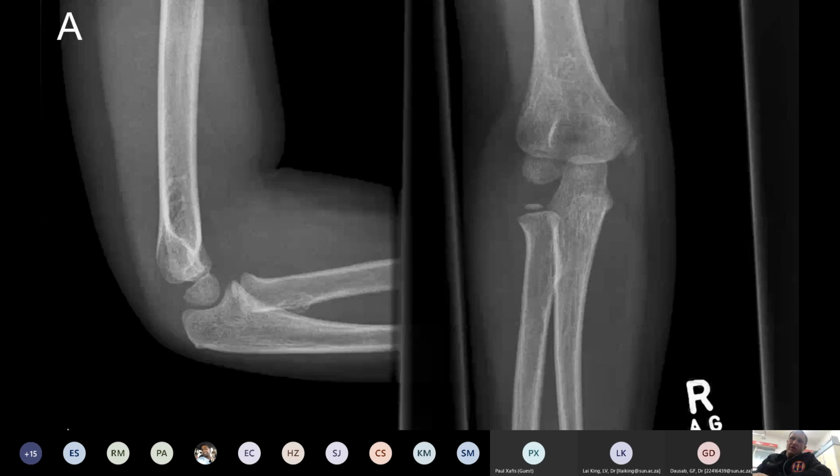I want you to tell me what's the age of this child, and just estimate it on the X-ray findings. Okay, so the maturity of the bone will assist you in this regard. And the question again, just what is the age of the child by evaluating the right arm X-ray? I'll give a few more seconds to imprint this, so if you want to take a picture, you can. All right, let's move on to the basics.